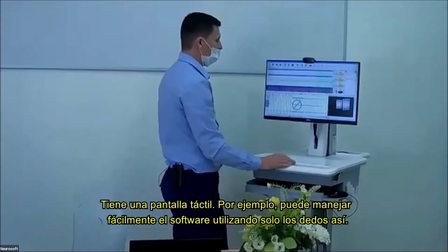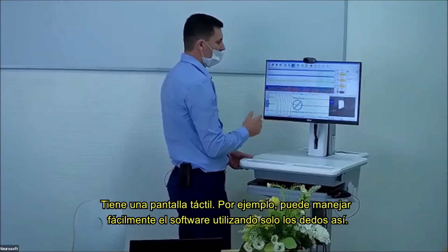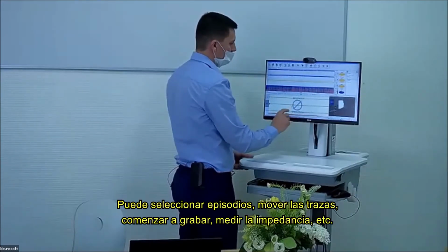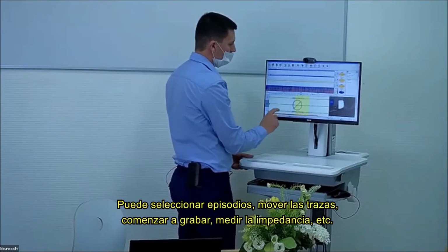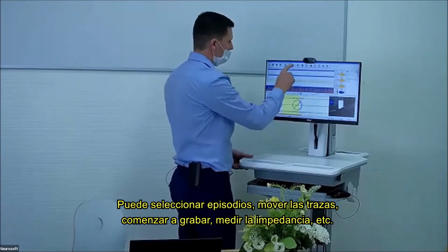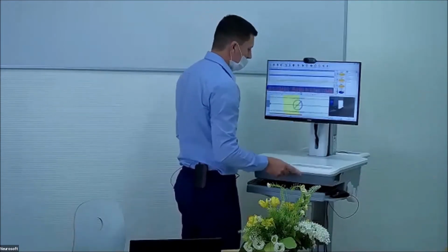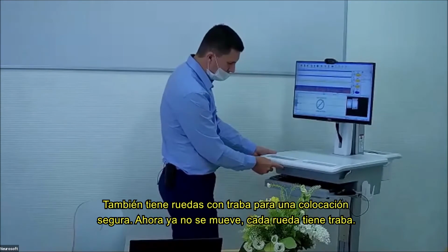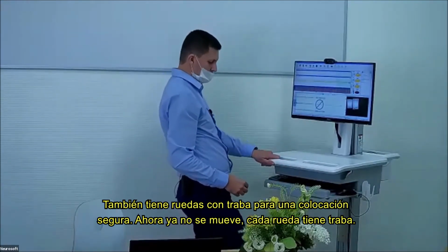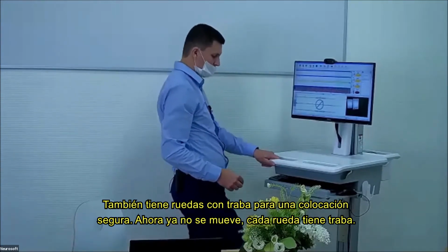It has a touchscreen display. For example, you can easily manage the software using only fingers, like this. You can select episodes, you can move traces, and so on. You can start recording, start impedance, and so on. Also, it has wheels with brakes for secure placing. Now it's not moving. Each wheel has brakes.